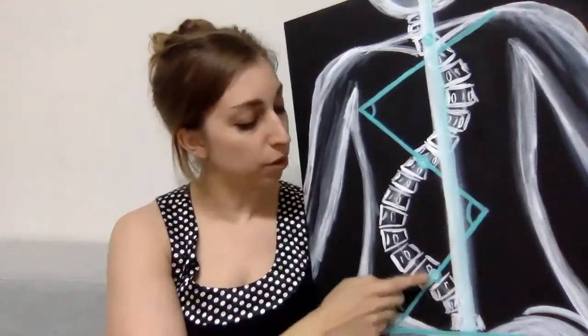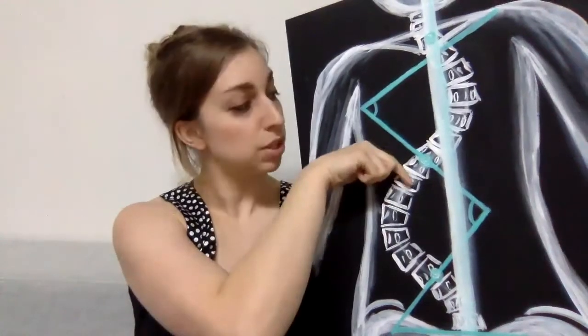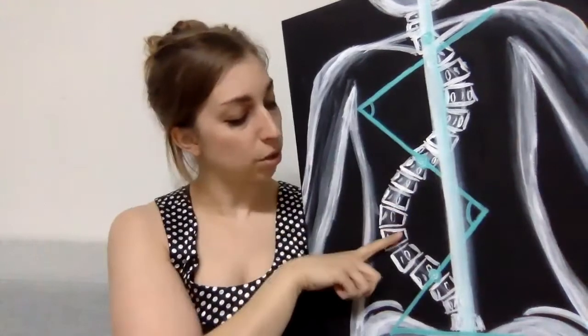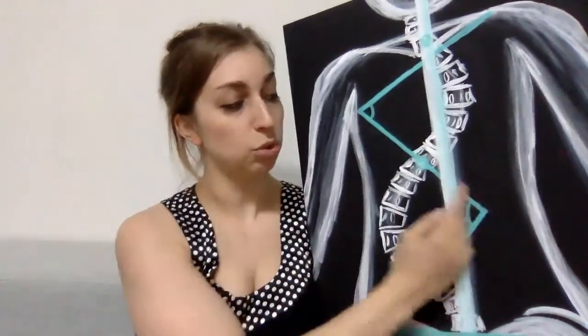We would do the same thing for the lumbar curve. Looking at the apex here, we would see what's most tilted, going up, up, up. We'll draw our line there. Apex going down, most tilted, draw it there. The angle between these two lines gives us our lower Cobb angle.